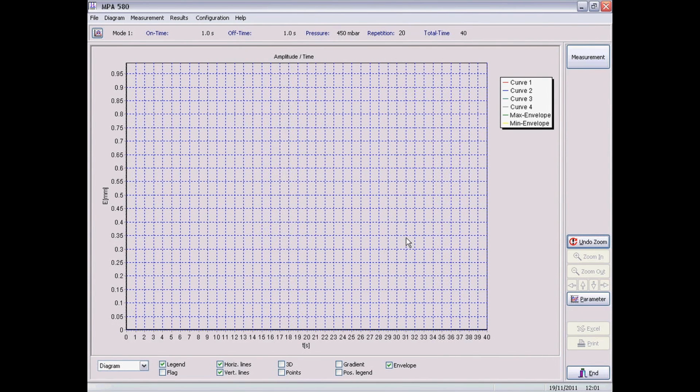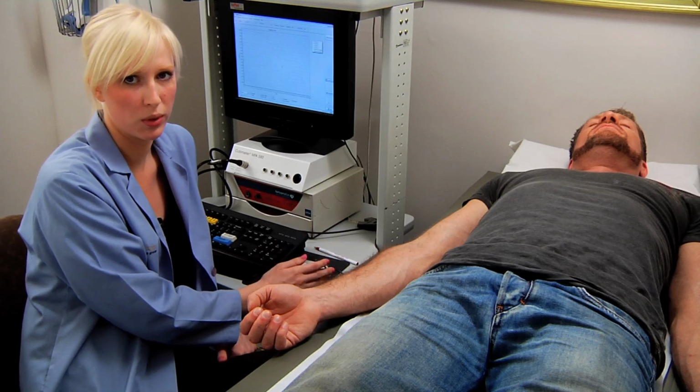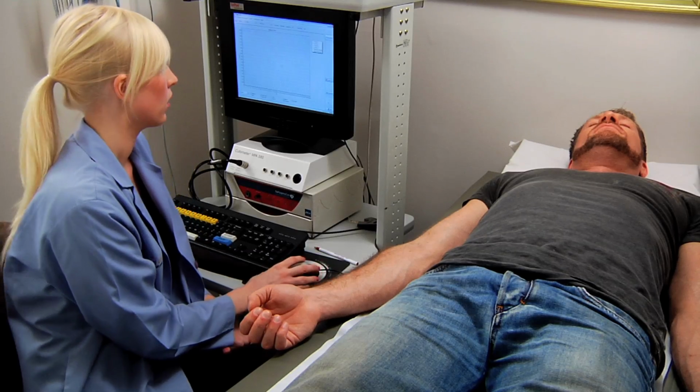To select a patient, you just select their name and hit exit. Now notice you won't see their name anywhere on the screen, but if you selected the patient and hit exit, that patient will be the one that's highlighted.